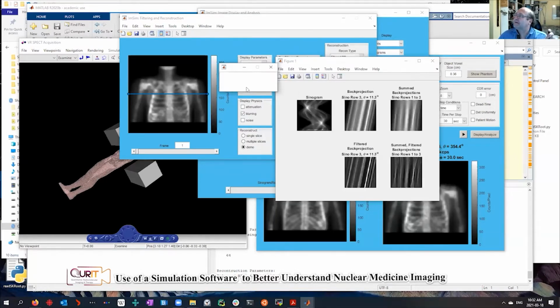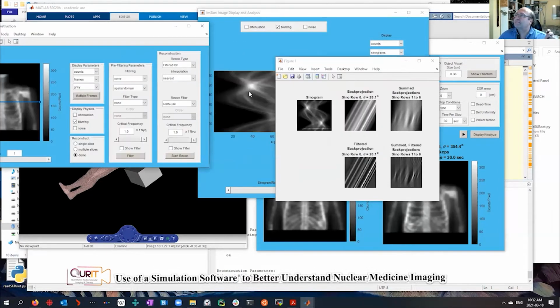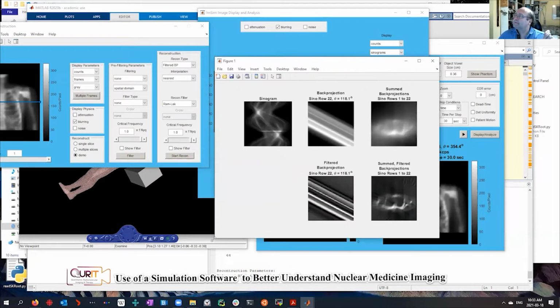Let's see. I'm not sure whether this is incorporating the blurry data. Hold on. Oops, something else just popped up. With the blurry data, you don't need as many angles. And it may not be incorporating that, so this may not be as good. If I acquired 128 angles, which we did not for time's sake, it would look better. Yep, exactly. Thank you for that.